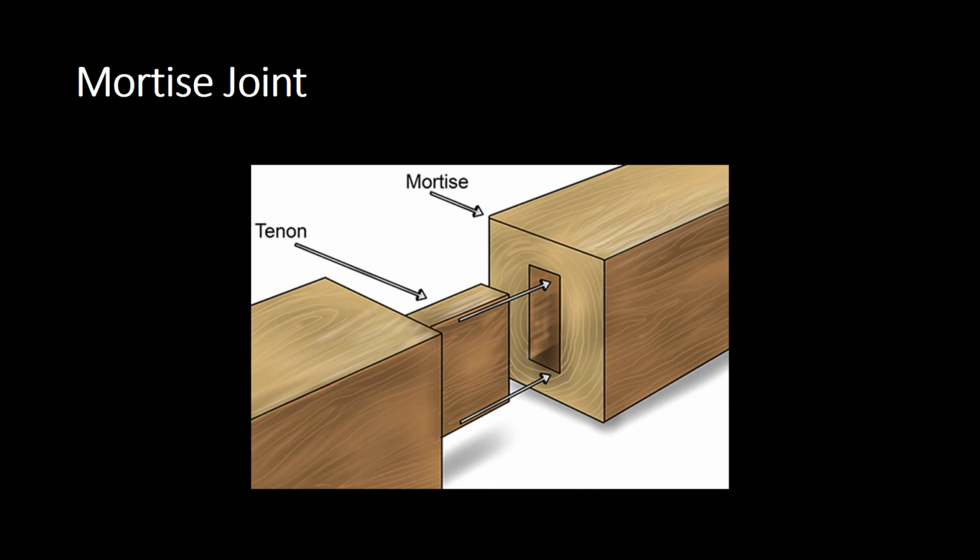We refer to the ankle as a mortise joint. We don't take an AP view of the ankle. The only time we take an AP view of the ankle is for orthopedics, and usually they will be asking for a 3 image series, so a lateral, a mortise view and an AP ankle. Now, what do we mean by the mortise? So a mortise is when you have a tenon and that gets recessed within the mortise joint.